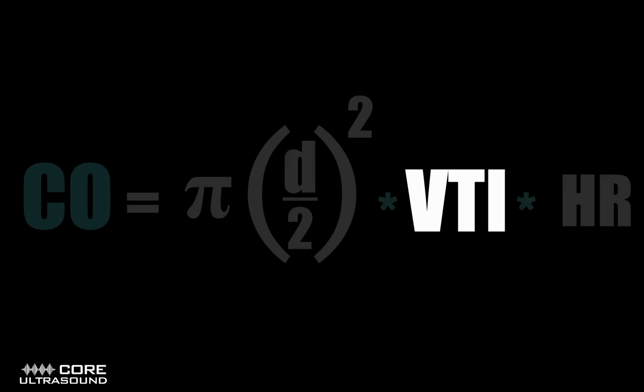And this is in the setting of trying to see if your patient is volume responsive or not. And what that means is if you were to give your patients fluids, would their cardiac output increase? And we really can do that just based off of the VTI in and of itself.